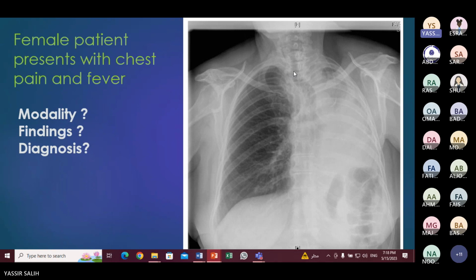The trachea and mediastinum shifted towards the pathology, اللي هو بيسموها ipsilateral, towards the affected side, ipsilateral not contralateral. يعني حصل pulling of the mediastinum towards the lesion. This is the ipsilateral deviation of the mediastinum without air bronchogram with decreased lung volume.